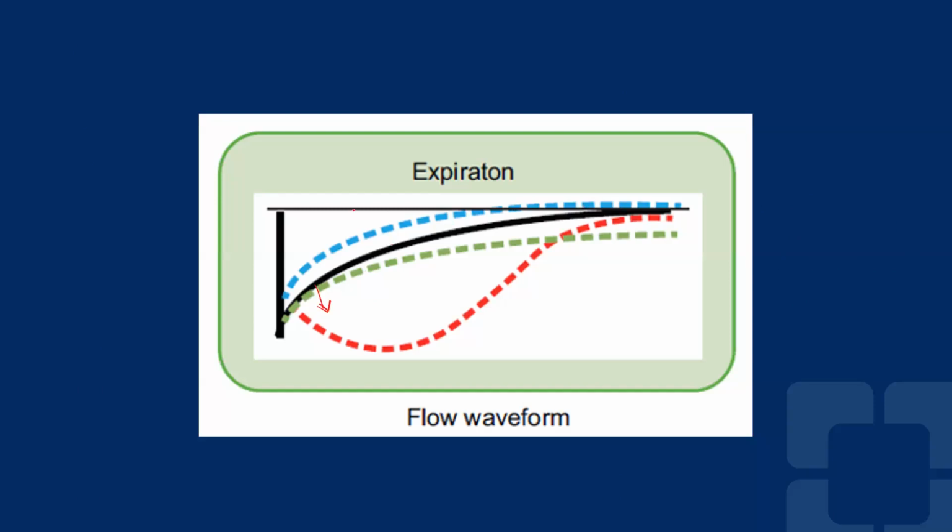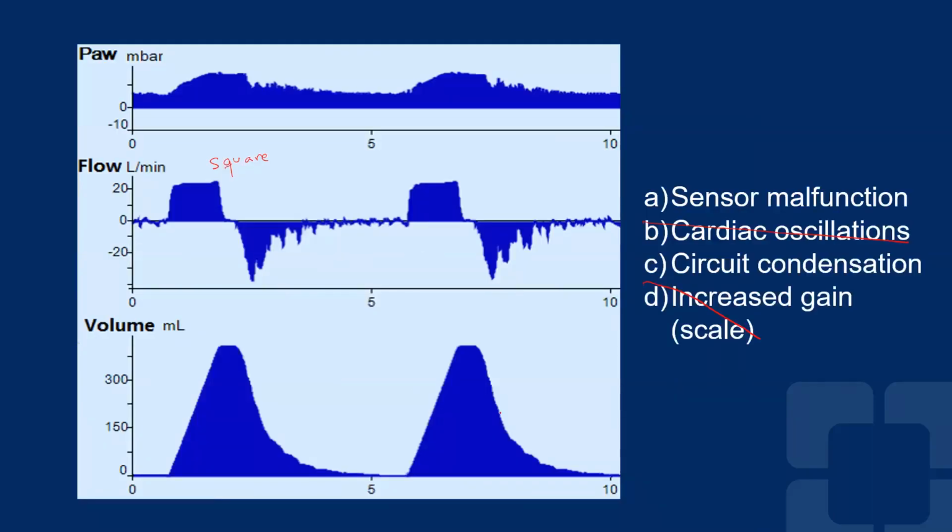Work shifting: because this is pressure control, in the presence of work shifting you would see the inspiratory flow actually moving upwards like this. It would lose this concavity, which means that it's passive, and you can see some of that, how it loses some of the concavity right here.